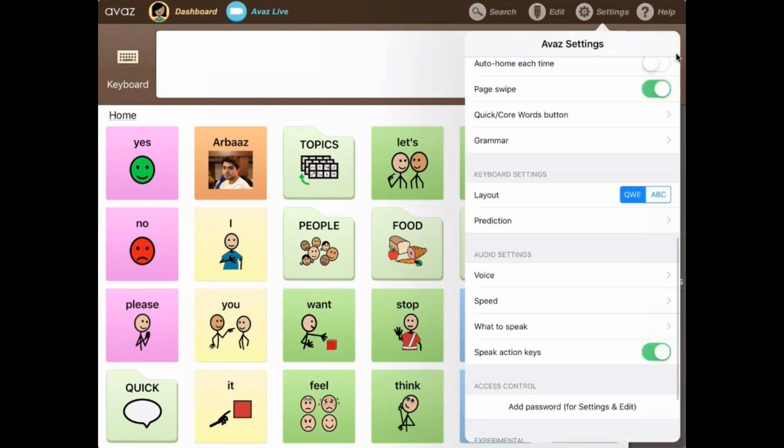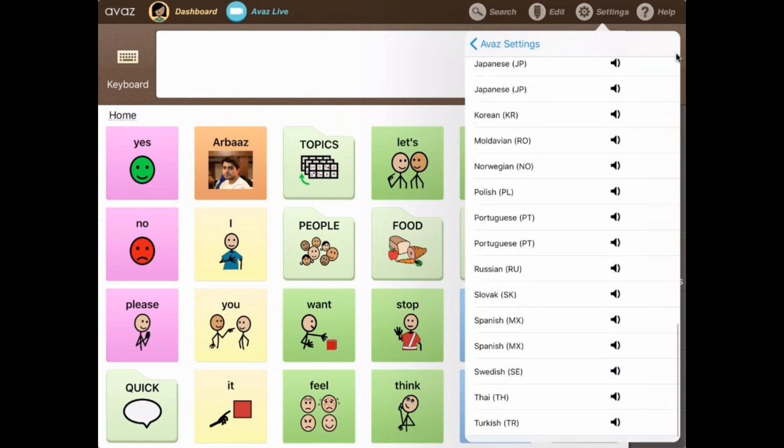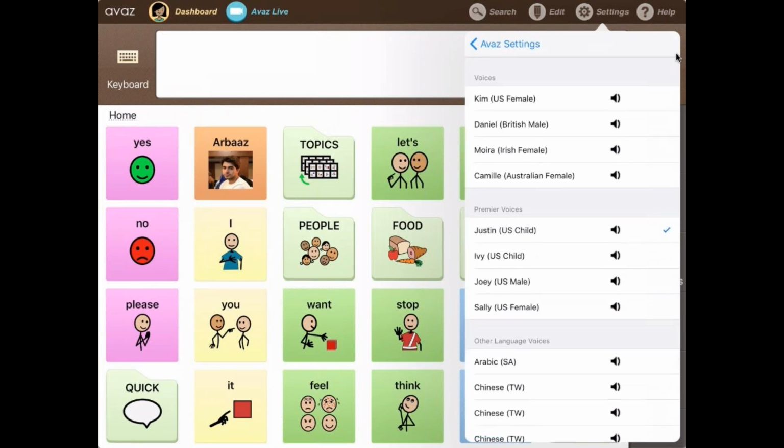And then you have the voices. So there are a bunch of voices for any professional, for any communicator to choose from. My name is Ivy. I can speak anything. Hello. My name is Joey. I can speak. Hello. My name is Sally.